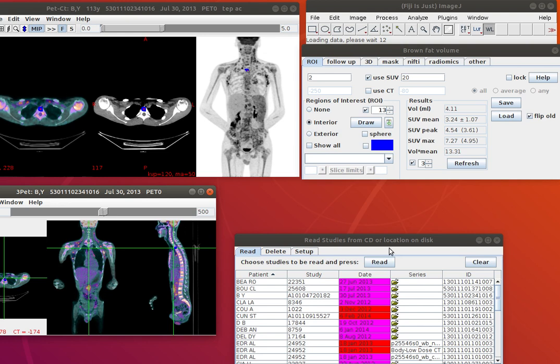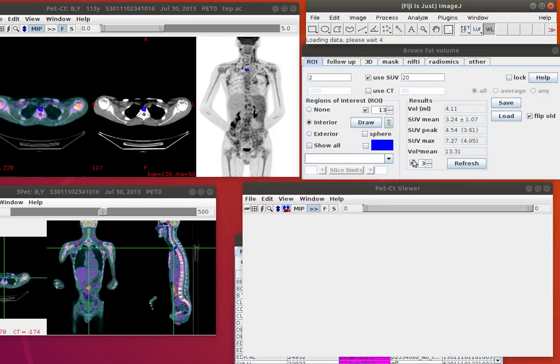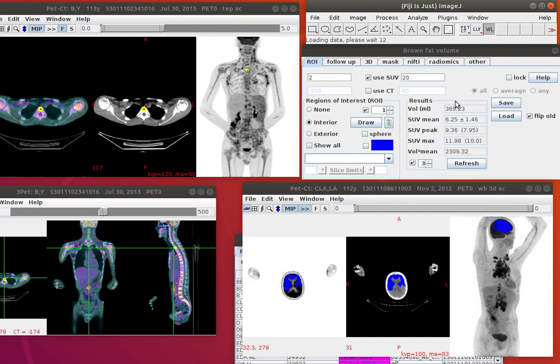The next thing I'll do is bring up the next study. We started with this one, so the next one is this. I'll ask to bring it up, and again pause. Okay, it's coming up, and when it comes up, these numbers will be replaced by the numbers from this study. So you'll see a change in these numbers. And let's just bring up finishing the data here.